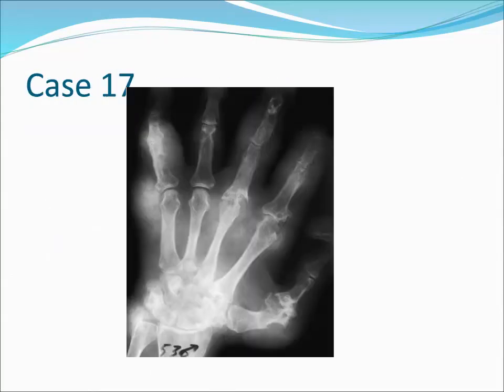Hand radiograph. Marked diffuse and focal soft tissue swelling is present throughout the hand and wrist in this patient with long-standing gout. Destructive, large, well-marginated erosions, some with overhanging edges, are noted near multiple joints. The focal areas of soft tissue swelling are called tophi, some of which are calcified. These calcify only with coexistent renal disease.